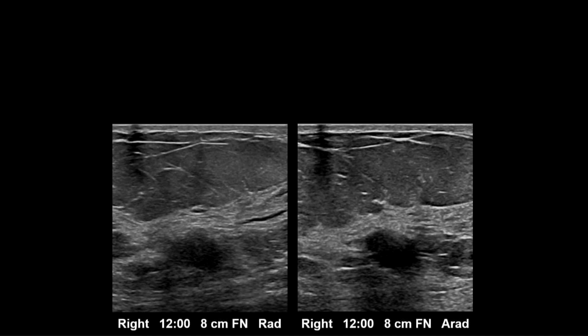If you start with the spot mags, you still don't know whether it's a cyst, so you always have to do the ultrasound. So do the one that can stop the workup potentially first because it's more efficient. And you just don't have to take extra images that aren't necessary.